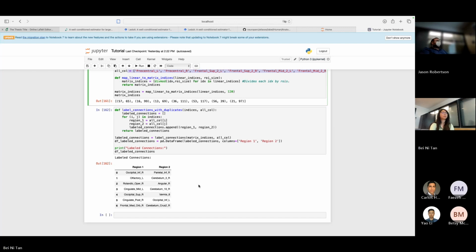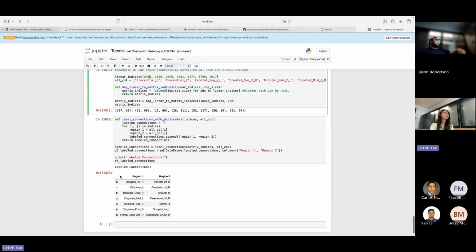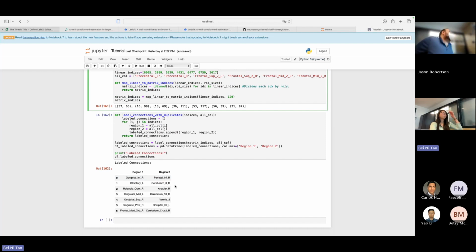Yes. All right. So feature number 6,905, you scroll up slightly. It corresponds to 57. Is that subject number 57, or no? Those are two different ROIs. So ROI 57 and ROI 65. Okay, and that is the right inferior occipital and right inferior parietal. Nice. All right. Let's stop it.